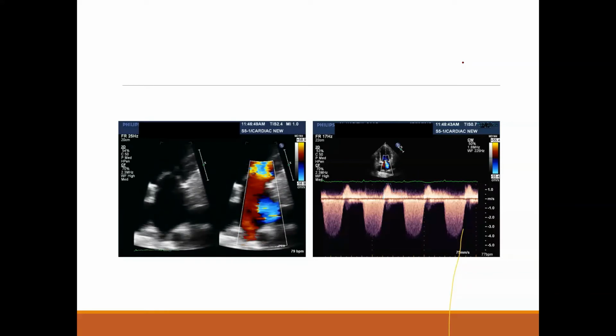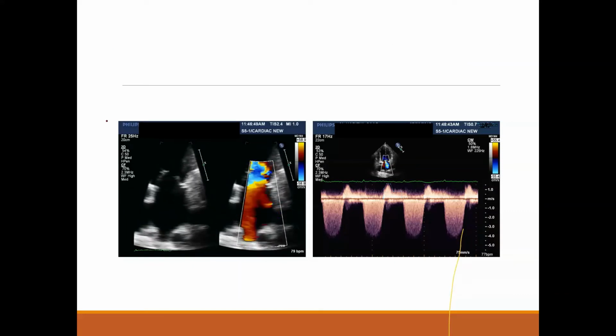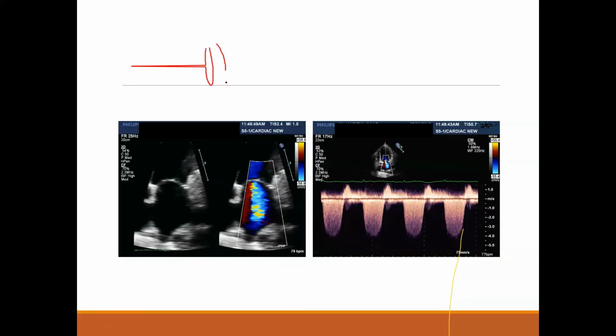Remember this one. Why might it mislead you? Remember we said before that what we are seeing here is not just the MR. What we are seeing is the MR and the entrainment around the MR. So if you have a central jet, that central jet is more likely to spark a secondary jet around it and gets magnified.